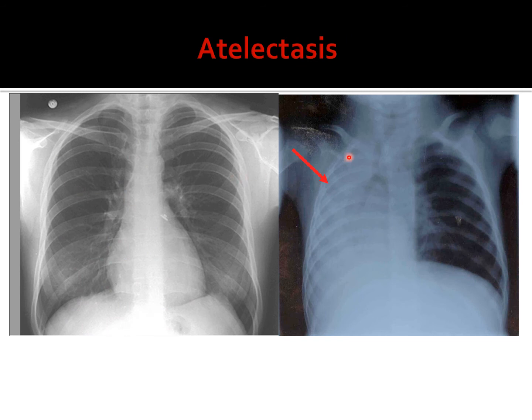This is atelectasis. You can see here homogeneous density on the right. The tracheal air column is deviated towards the side of the injury, or ipsilateral, and even the cardiac shadow is deviated towards the side of the pathology. And you can see here that there is hyperaeration of the left lung field.